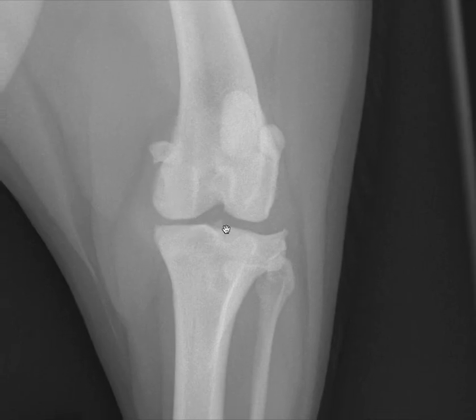We are unable on radiographs to differentiate soft tissue structures within the joint. In the case of the stifle joint, this could include the menisci at the medial and lateral aspects of the tibia, as well as the cruciate ligaments, the joint capsule, and any periarticular ligaments, such as collateral ligaments, or even the patellar tendon. Those all have the same opacity as the synovial fluid. This results in the radiographic joint space having structures which we know are in there and in many cases are really important, but we can't really see them.